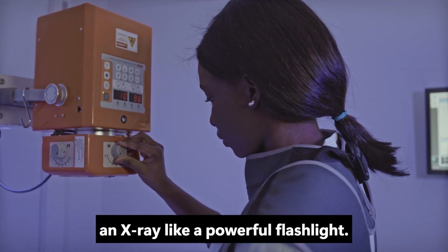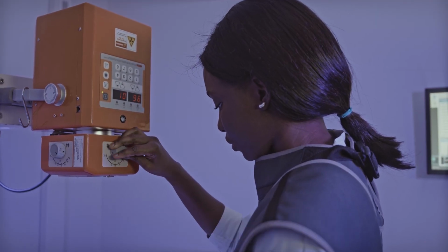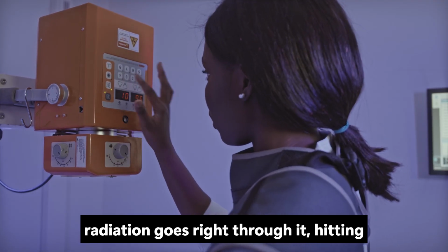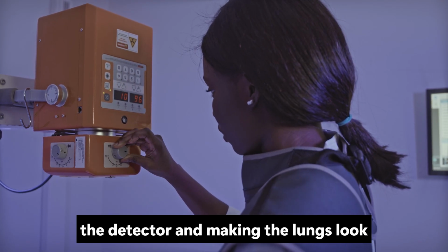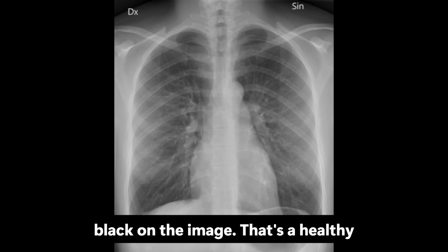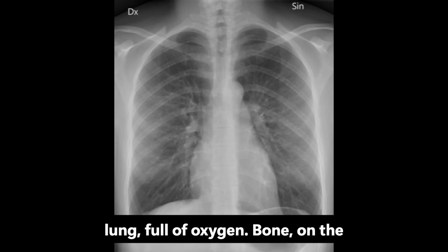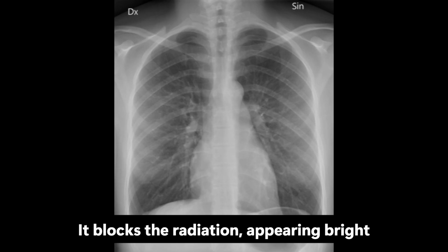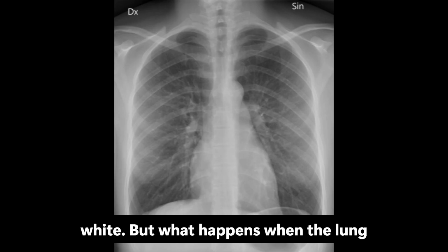Think of an X-ray like a powerful flashlight. Air is like a clear window. The radiation goes right through it, hitting the detector and making the lungs look black on the image. That's a healthy lung, full of oxygen. Bone, on the other hand, is like a brick wall. It blocks the radiation, appearing bright white.